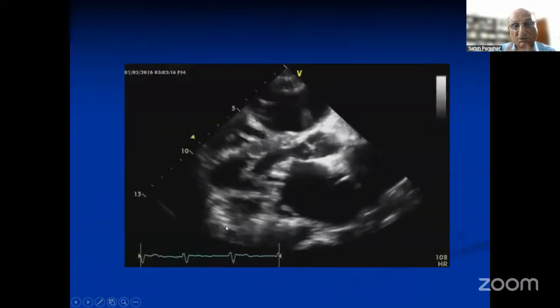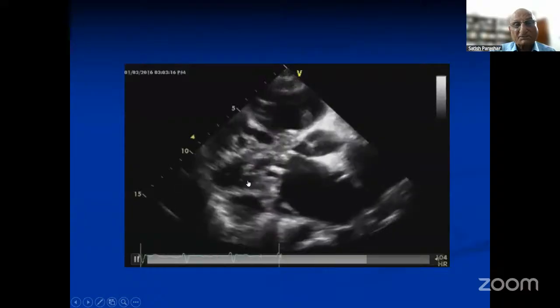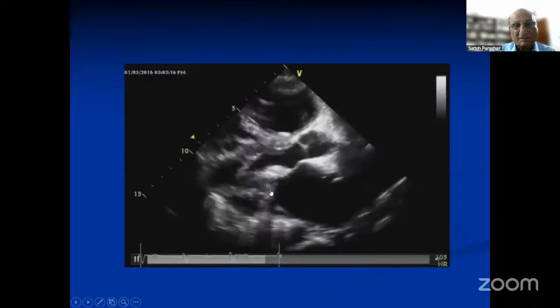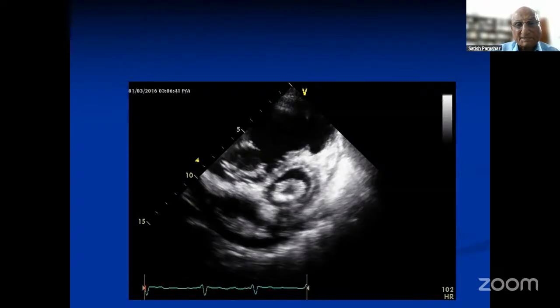So you see, rheumatic heart disease is very well known to all of you: thickening of the cusp, paradoxical motion of the posterior cusp, doming and whatnot, that is all known to you very well. But the most important thing is commissural fusion, which is a sort of hallmark of this. Now, it will mainly be a case-based presentation of some cases we saw.